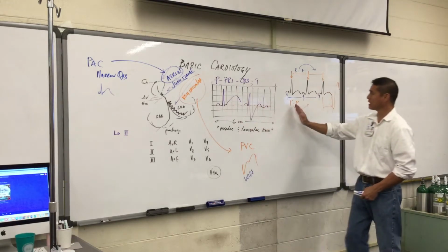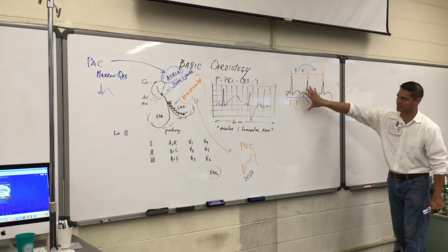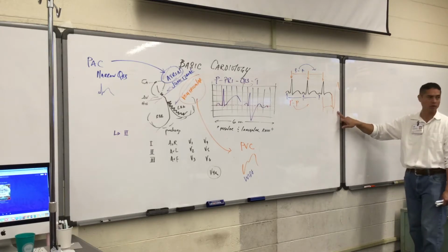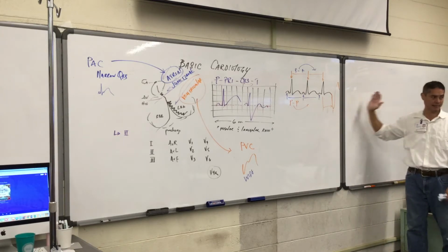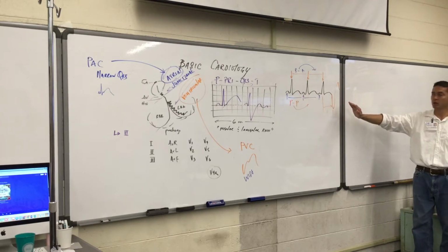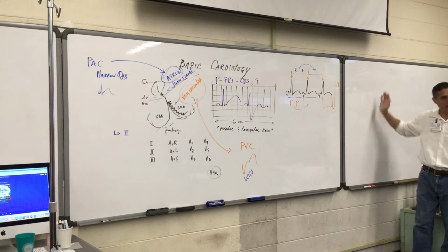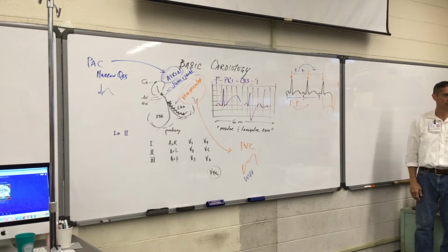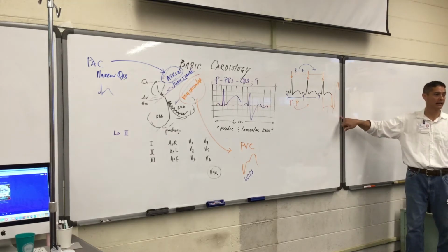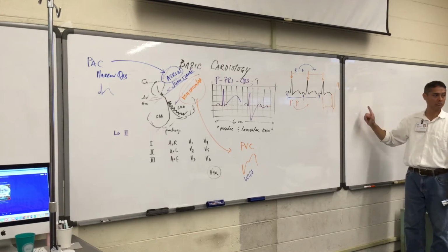Again, if this was our first 3-second strip, and I were to copy this exact item and place it on the other 3-second strip, I would have 1, 2, 3, 4, 5, 6, 7, 8. I have a sinus rhythm with 2 of these wide PVCs, or ventricular ectopy, at an overall rate of 80. So now they would say, okay, you have 2 ventricular ectopy and it's considered part of the 80. So that means you would have 6 of these, 2 of those.